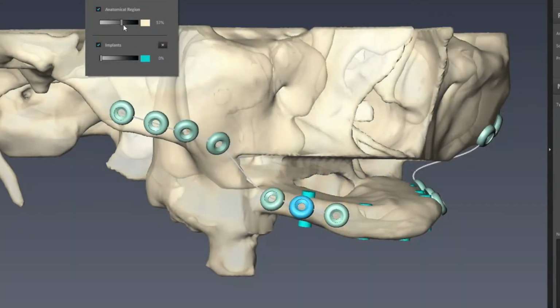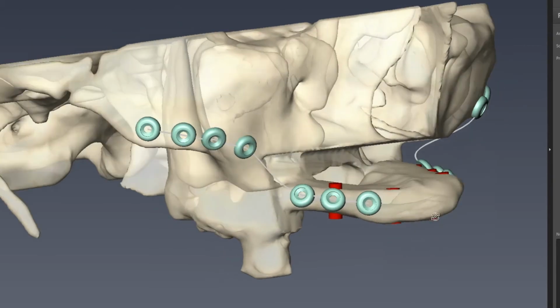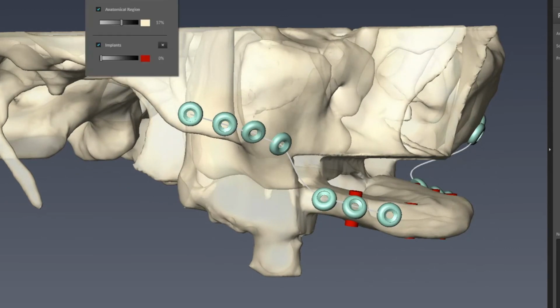Okay. So we may have to go for a smaller plate. I can't remember what diameter did we use? 2. Yes, the 2.0 MP. What's the next size down? 1.7 screws. Let's go for 1.7. Okay, yep, no problem.